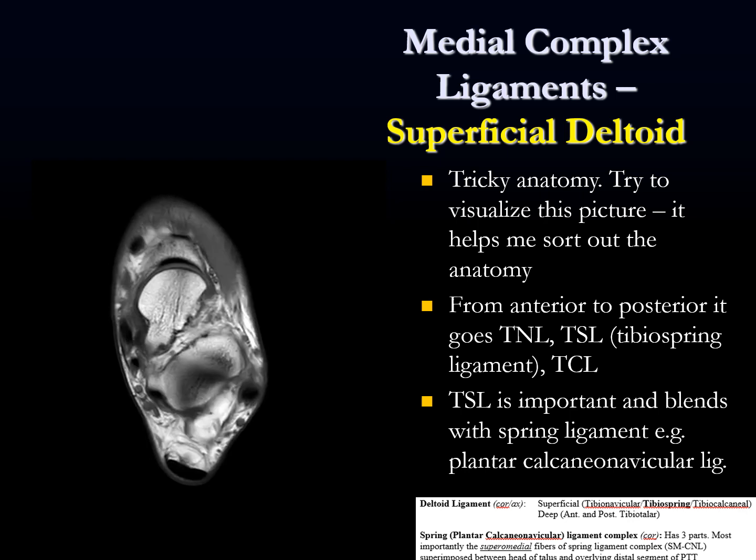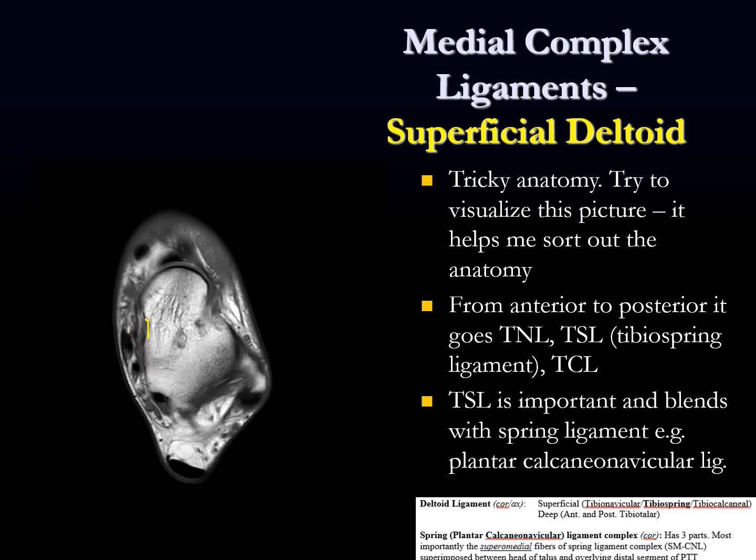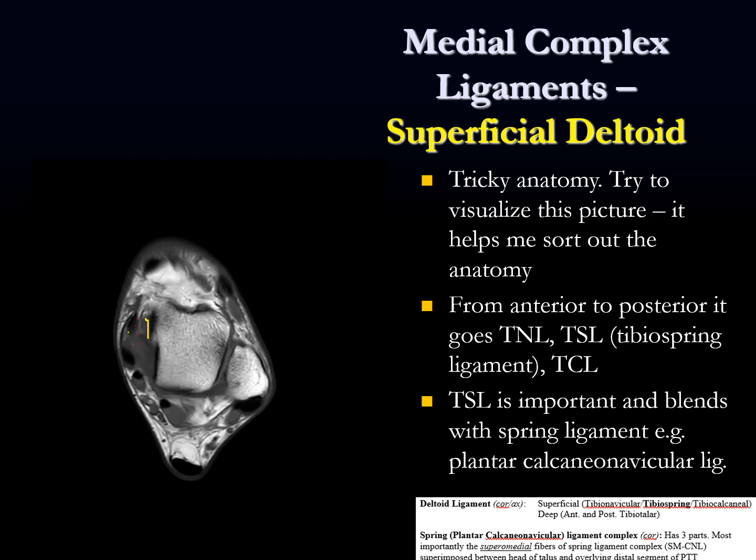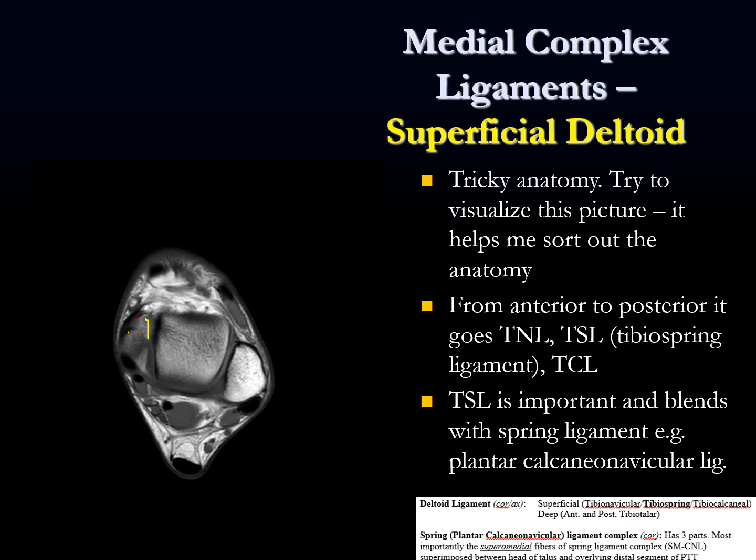All right, so this is our tibialis posterior. This is the concavity of our neck here. So we think this is going to kind of be it here somewhere, which I want to erase because we're not going to be able to see anything. So I think this is probably a pretty good look at it here, like that little dark band right there. And there, as it comes up to attach.